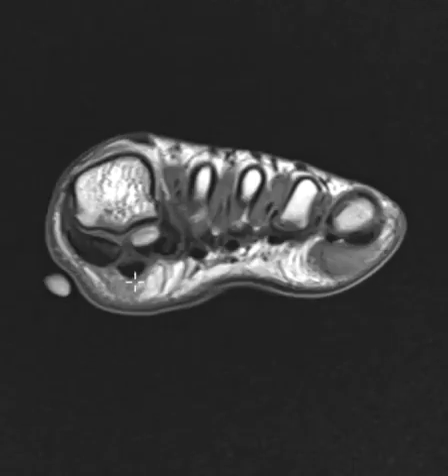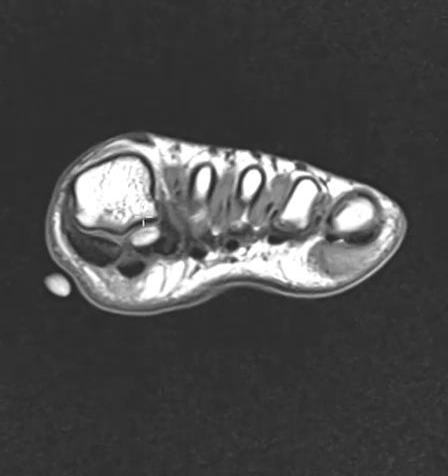Now the real finding is over here where they have the pain, and we see that the lateral sesamoid looks pristine, nice normal signal. The first metatarsal head looks great, and then the medial sesamoid bone looks totally abnormal, really low signal, really kind of profound low signal. So this can be related to just edema. We'll have to look on the other sequence to see, or can be related to reactive bone sclerosis. With an injury, they can have trabecular microfracture or too much stress and get reactive sclerosis. And with sesamoiditis in the acute phase, usually it won't be so dark on the T1 weighted sequence.